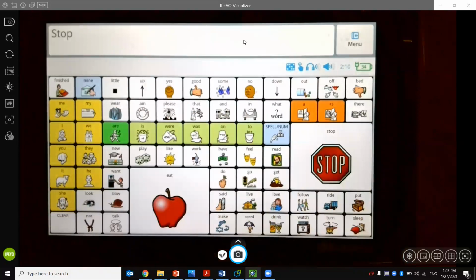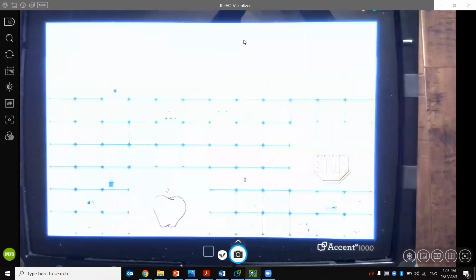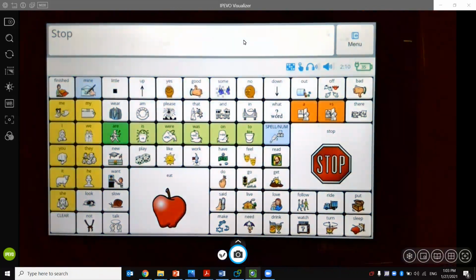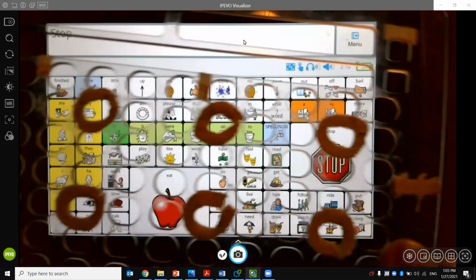So you only use this feature after you've exhausted everything else. There are two tricks I want you to remember. Especially, I'd much rather you did this trick where you put in a keyguard that has a hole punched in it like this. I know most of you know how to do that, but that would be your first step, using vocabulary builder and all those things. You might even try something where you have a tactile reference on a location before you go to this step.